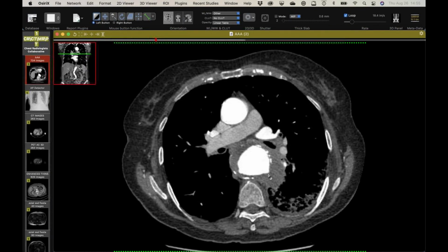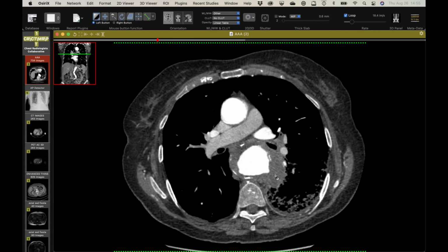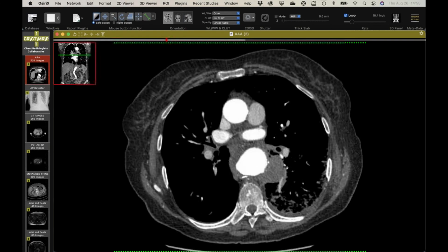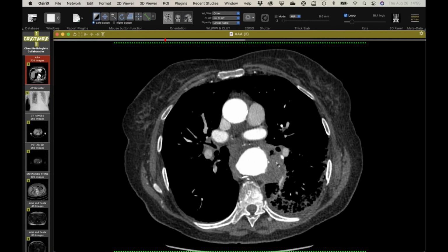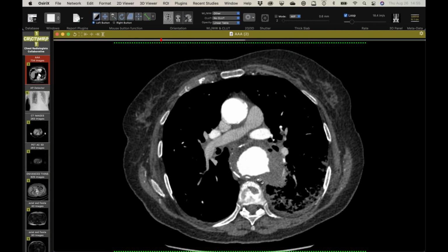But looking at this, this really looked to me more like something's wrong with the aorta, and that had eroded into the lung. You see this displaced pulmonary vein right next to it here, and then the airway being sort of deflected. There's a little bit of aerated lung. And then this mass just kind of goes right up against the aorta, and there's this irregularity.